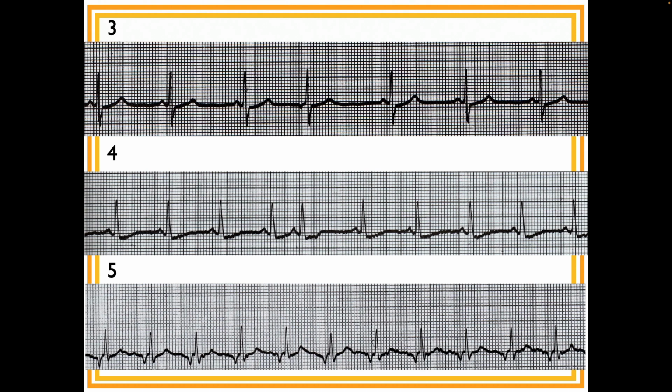The rhythm is regular. The underlying rhythm is regular except for this right here. Rate is 70-ish? Well, 10, 20, 30, 40, 50. I think it's probably closer to 60 myself. Oh, I can't count. Oh, okay then, that excuses it.